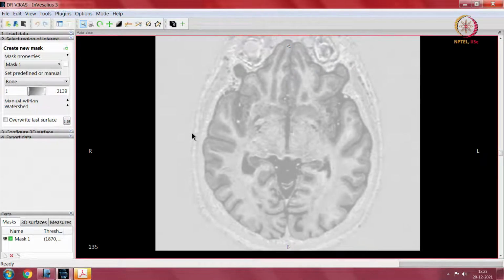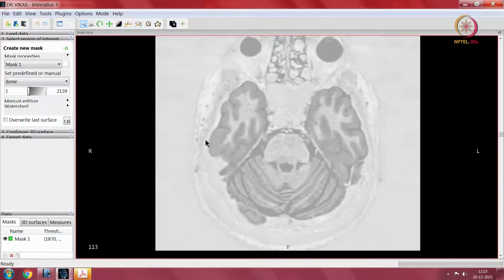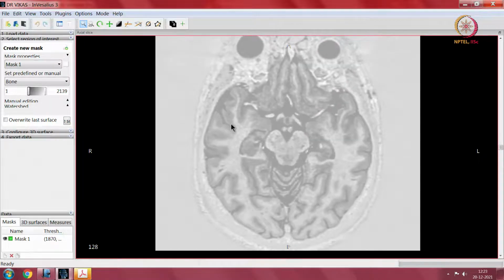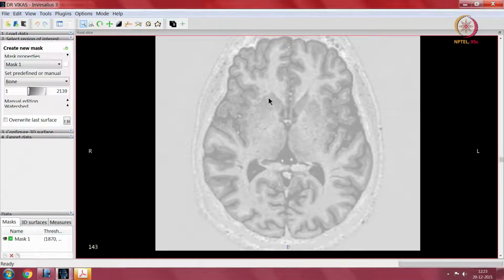What happens above is the cerebrum comes into place. So, we go back from below. On either side, the first structures which you see almost in relation to the eye are the temporal lobes. So, this is the left temporal lobe, right temporal lobe. Yeah, so this is another place. This would be the frontal lobe, parietal lobe, occipital lobe.